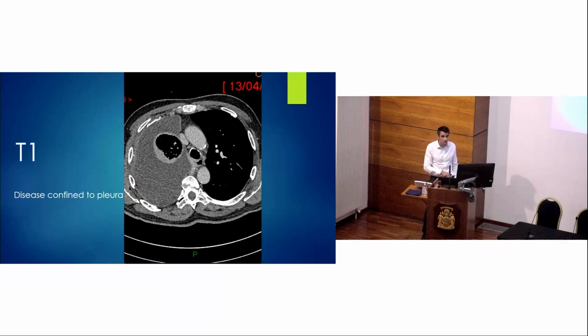So enough about tumour that we can't see. Here's some tumour that we can see, and I'm just going to work my way through the T staging. So here again, we've got a CT scan. Now, these bright white lines here, deep to that rib and deep to the rib here, these are the pleural plaques that we saw in the chest x-ray. So we know this is a patient who's been exposed to asbestos. We've got a large pleural effusion, so we're suspicious that there's malignancy about.